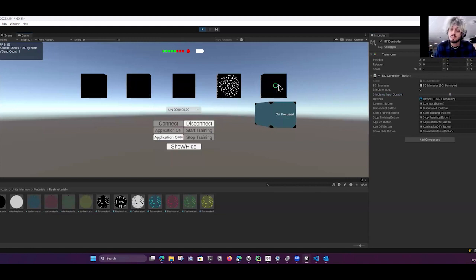You can build the entire game without connecting the device and test all the dynamics. Of course, it's better if every now and then you test with the real device and the person. But in the meantime, since you will be working in 4, 5, 8 people on the same project, everybody can contribute to the development. This is good for games, it's good for artistic projects. That's up to you.